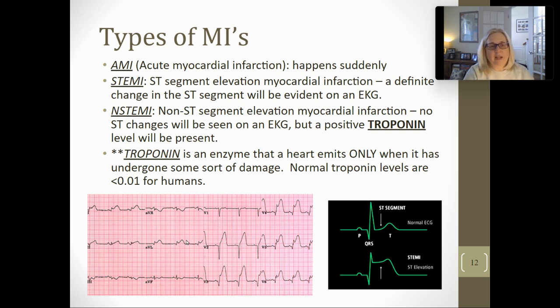Really cool thing. Then I look at 2, 3 and AVF. I see a little bit of maybe ST depression here. Nothing really matches, so I'm going to say that's non-diagnostic down there. And I look at V1. V1 looks okay. V2, V3, and 4, these all look a little funky to me. This is definitely ST elevation. Here's the S wave way up here.